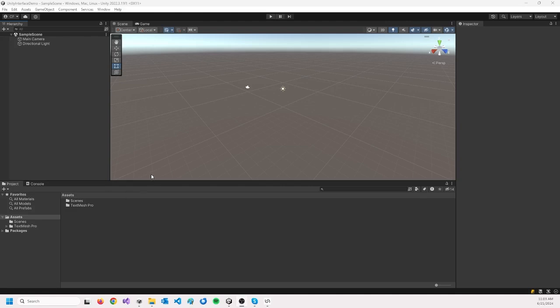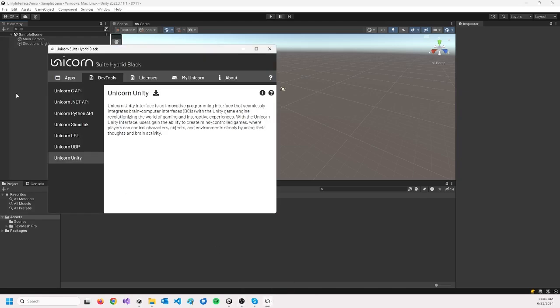Hello, in this video tutorial I'm going to show you how to use the Unicorn Unity interface. First of all, open the Unicorn suite. Go to the Unicorn Unity interface and download the Unity interface. Install the Unicorn interface.